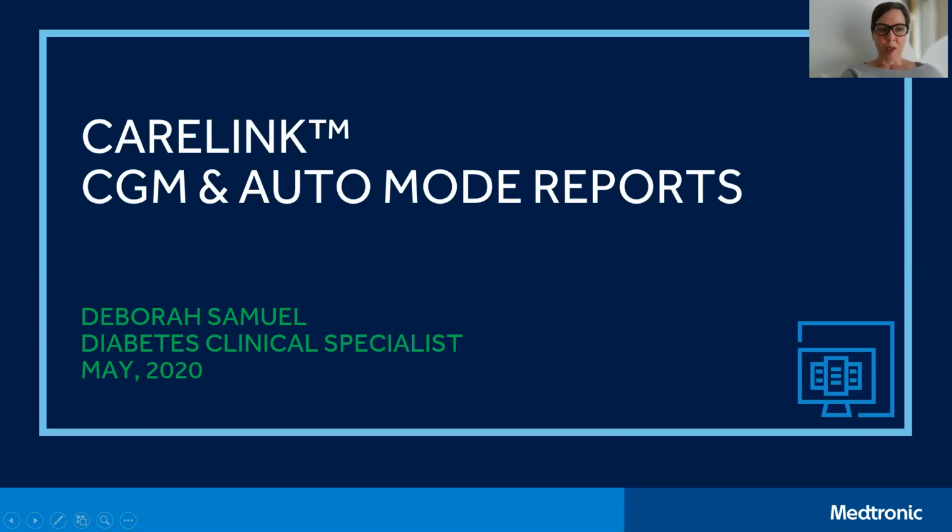Hi everyone, welcome back to the third video in our CareLink series for education and support videos meant to help you prepare for your remote visits with your healthcare team. In this video, we're going to take a look at how to read and assess CGM and Auto Mode reports.